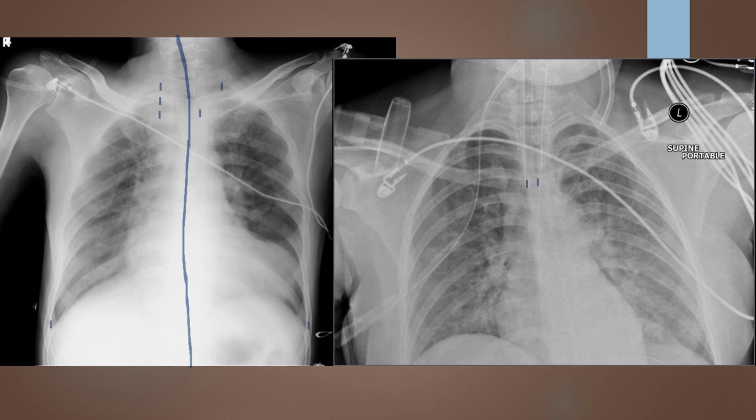However, if this was for a series or a true evaluation of the chest, we can see right off the bat that it's not going to pass the test. As soon as I start to do my global view, I have apices, but I am missing costophrenic angles. So right there, I have clipped anatomy.